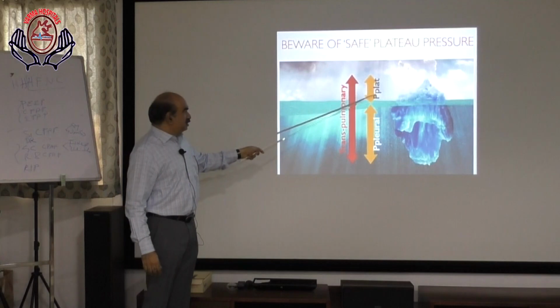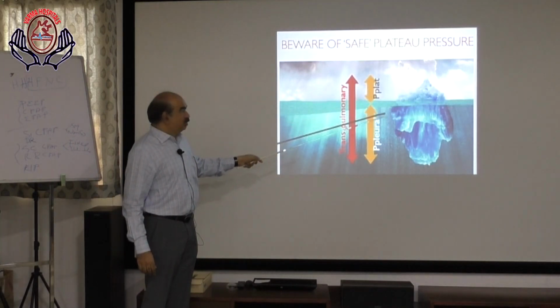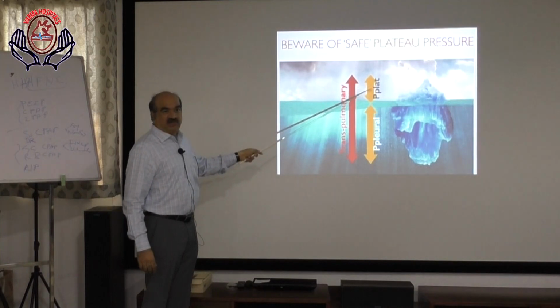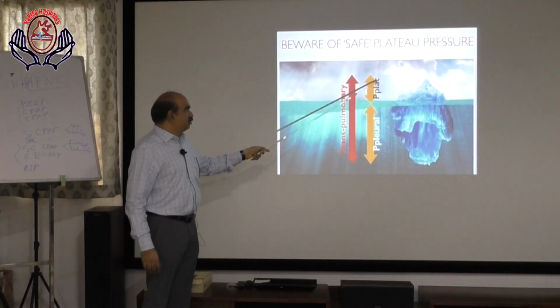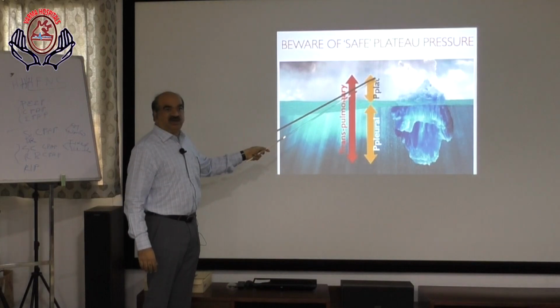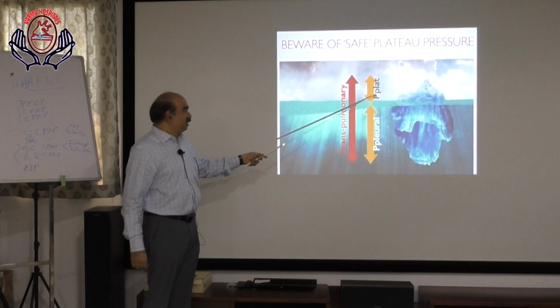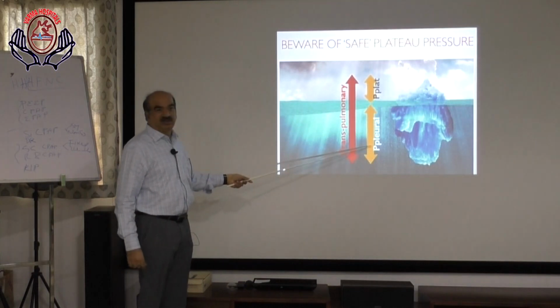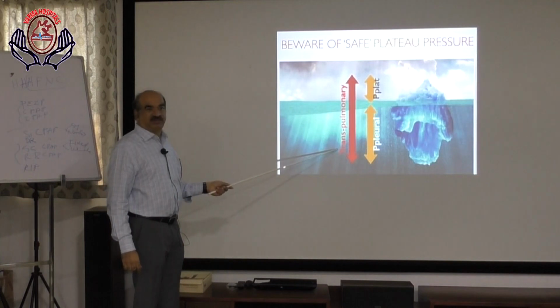Even in the pressure time scalar or in the pressure volume loop, in the pressure time scalar we will assess peak pressure. In the volume control mode, with inspiratory hold breath, we can measure plateau pressure. But we don't know pleural pressure, we don't know transpulmonary pressure.